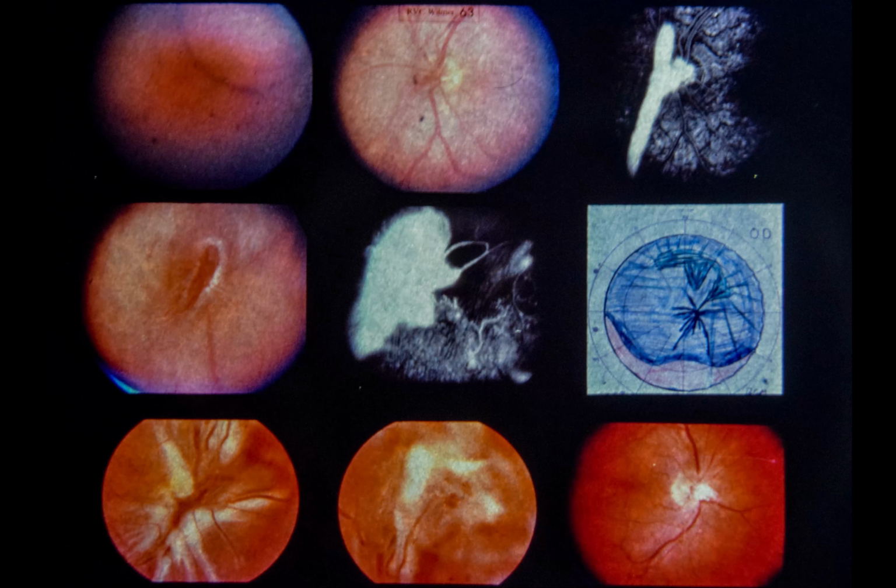Slide 63. Idiopathic proliferative retinopathy with vitreous hemorrhage. This 17-year-old white male presented with bilateral vitreous hemorrhage. Upper left, note that all fundus details in the right eye are obscured by vitreal blood. Upper center, note stalk of elevated disc neovascularization, left eye. Upper right, note leakage from disc neovascularization, left eye, 30 seconds after dye injection.